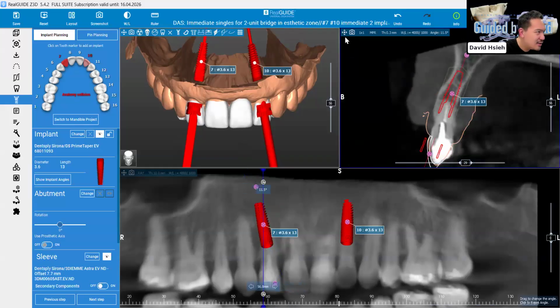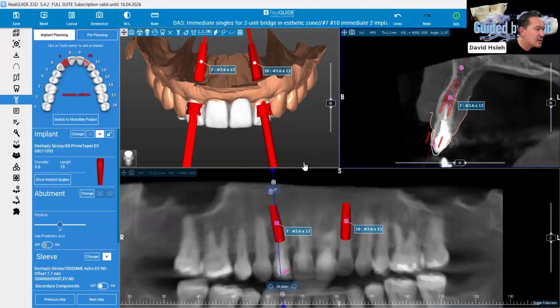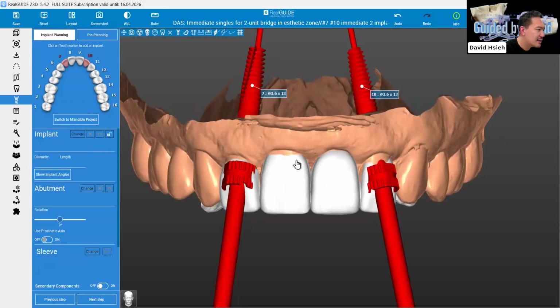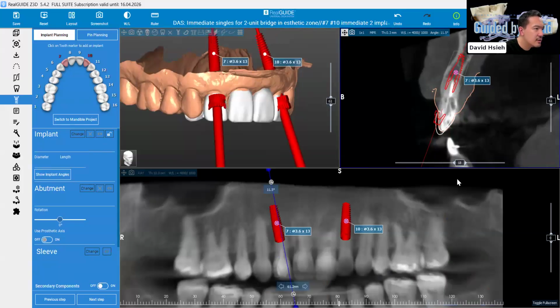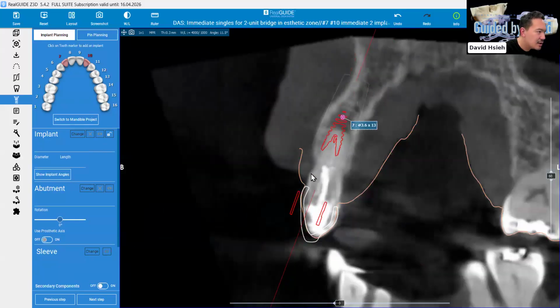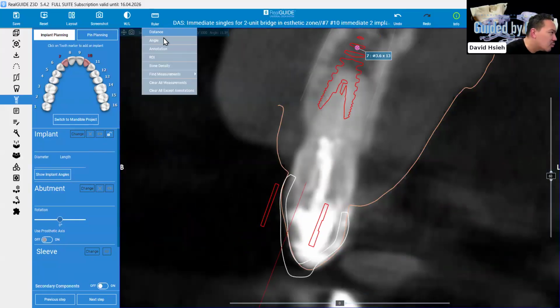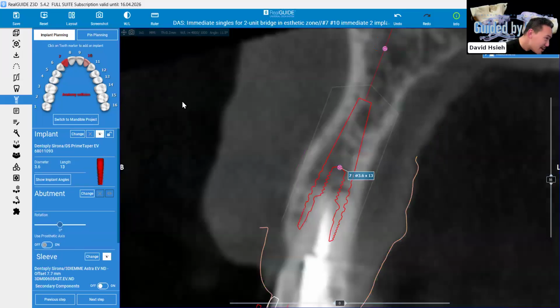So you can drag here, because we placed the implant, the wax up already. As we can see here, this is the gingival zenith at the central and that's the lateral. Let's say, yeah, this is a pretty good spot. So let's see if we come here, see the gingival zenith is right there, right? That's a good spot. So let's see if we can do our 3-2 rule there. From the gingival zenith down 3 millimeter, you say, oh, this is deeper than that. Okay, let's see if we can make that happen.